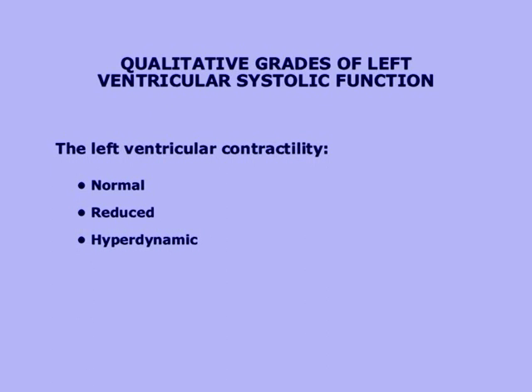Qualitative grades of left ventricular systolic function. Normal ventricular walls thicken during systole, a manifestation of myocardial fiber shortening. Ventricular systolic contraction is accompanied by a reduction in ventricular cavity size and can be qualitatively assessed as normal, reduced, or hyperdynamic.